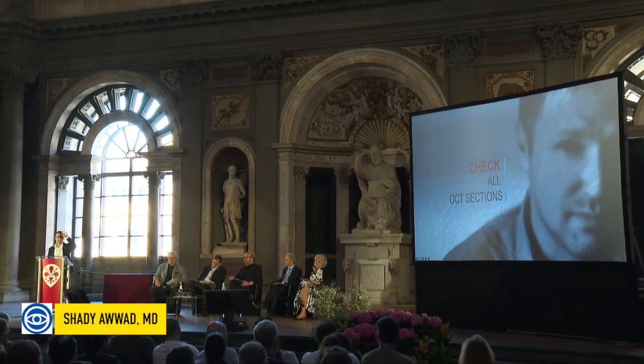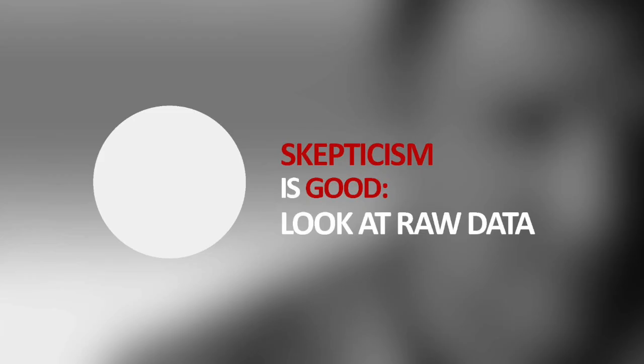Another tip is to check all the sections. Don't just look at one. You'll be surprised what you can find. So skepticism is good. Look at raw data.